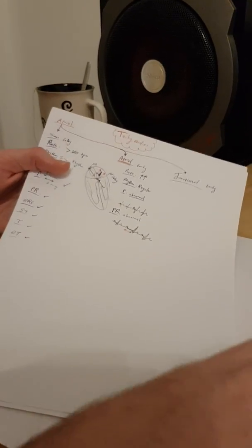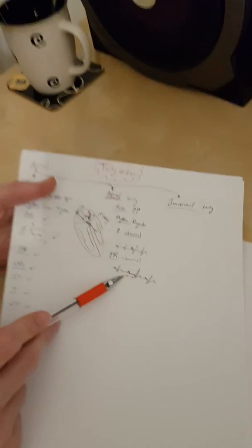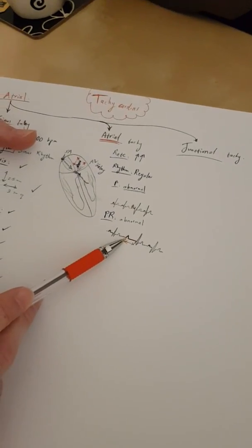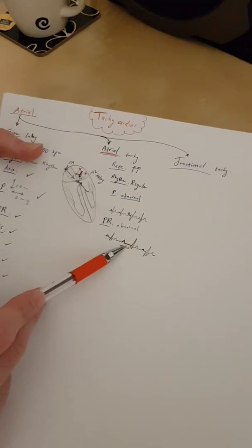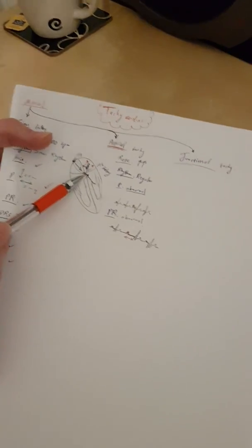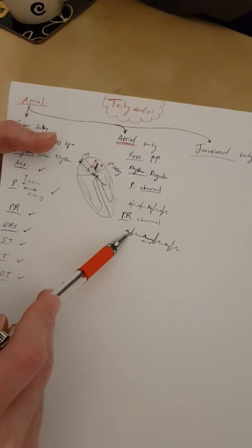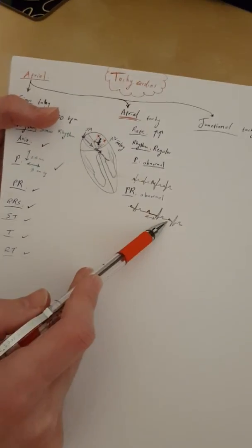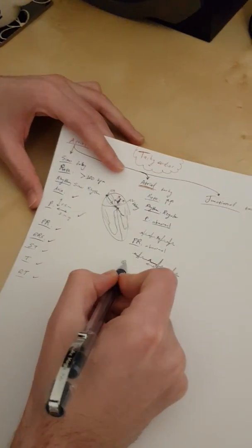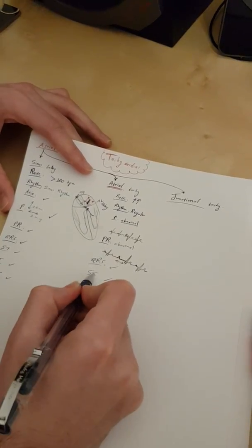I should have drawn the P wave in a different shape to show you that this is prolonged because of the fact that it's not sinus, so it can be different and it doesn't mean a block. If it's a first degree block, then this block would have affected this and this and this, so it should affect the normal ones too. Then you can name it a first degree AV block. Okay, so here's the thing, yeah, this is it. QRS gonna be normal, ST fine, T fine, all fine.